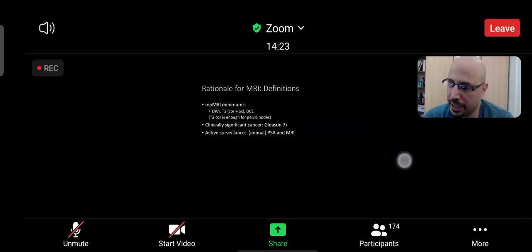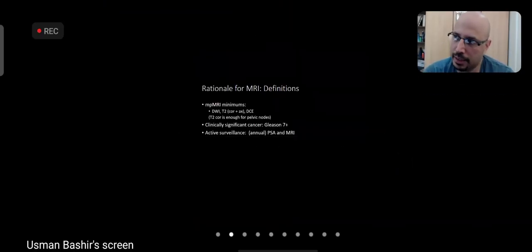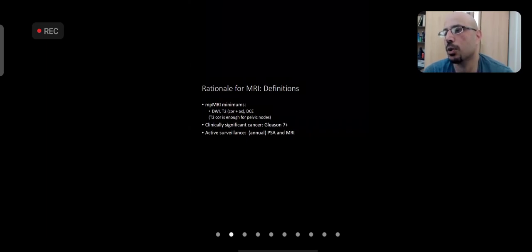मैं आपको बाद में दिखाऊंगा एक पूरा टेम्पलेट जिसमें सारे मैंने सीक्वेंसेस अरेंज किए होंगे, and then I'll talk you through how I analyze a typical scan in my day-to-day practice.